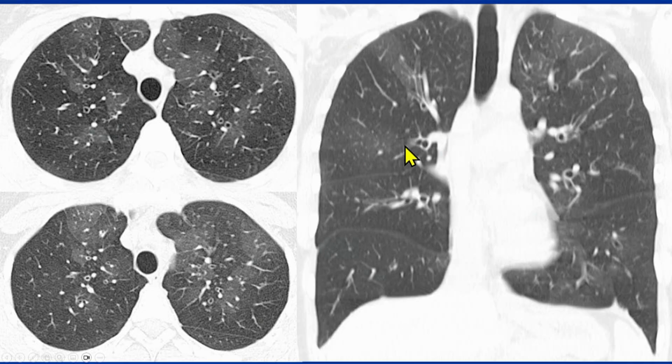Okay, here's a nice example of obliterative bronchiolitis. You might have thought initially that these areas of higher density were just inflammatory ground glass opacity. These are actually the normal portions of lung. The abnormal portions of lung are these hypodense regions with associated areas of internal bronchial wall thickening. So, large areas of mosaic attenuation, which are shown to represent air trapping.